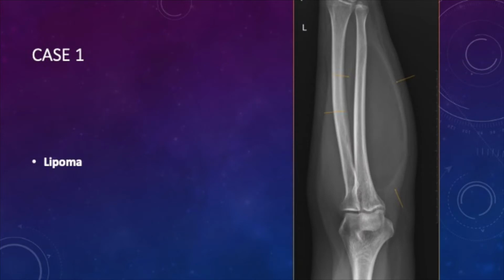But just using this X-ray alone, we can at least determine that this is one of two things, and there are many other things that it is probably not. Could this be a cystic lesion? Of course, and so that's why, again, these aren't hard and fast, these aren't perfect algorithms, but they are generalities.